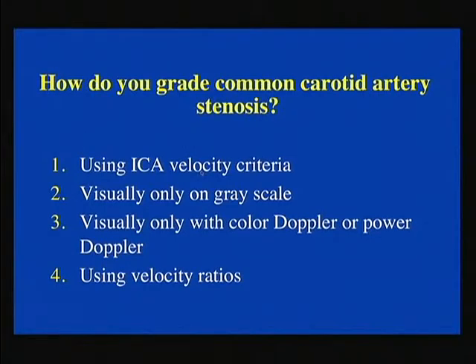Good alternative. Kind of goes against the principles we've discussed this morning, right? Color Doppler by itself or power Doppler, not really. It's an adjunct. It's something for supporting this, correct? So we don't want to do that. What about velocity ratios? Anybody want to use velocity ratios?